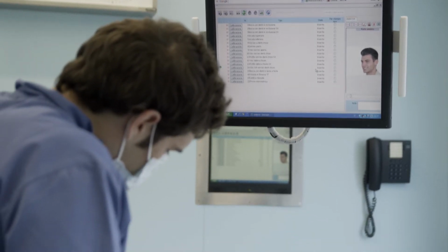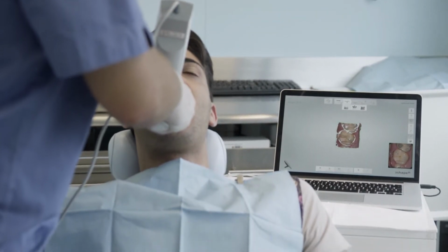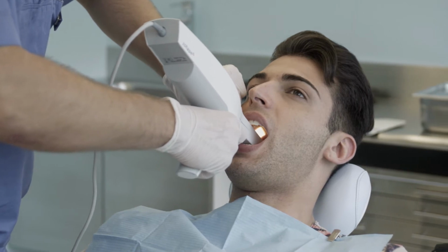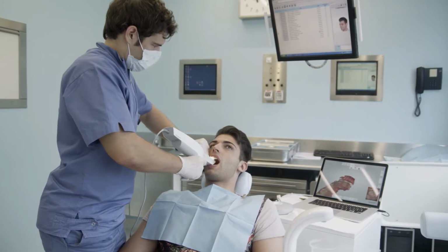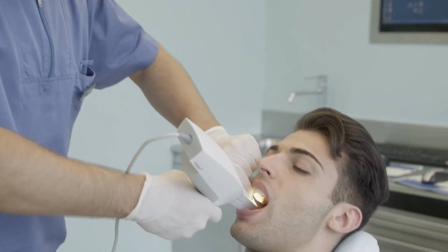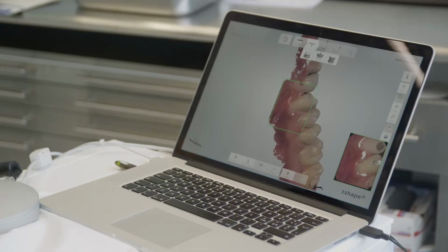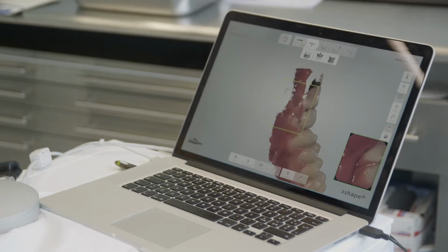If you use intraoral scanners with SmileTron, you can import the 3D files to visualize and examine the patient's arcades in 3D. Take the measurements and share them with the lab, which can then import them into the CAD/CAM systems. With intraoral scanning, you no longer have to send the physical impression to the laboratory.